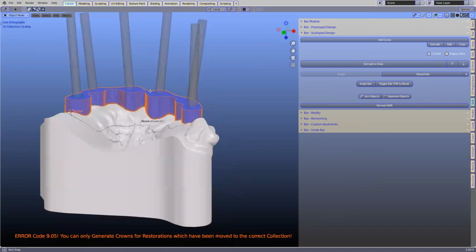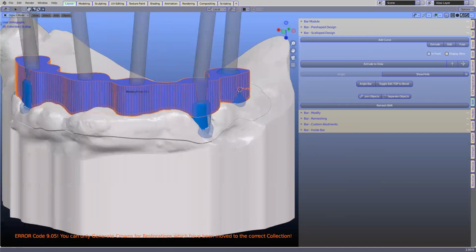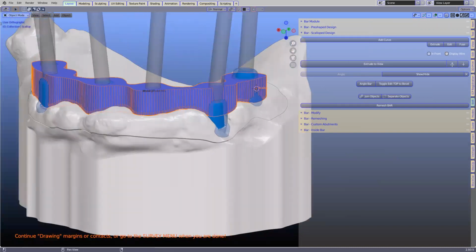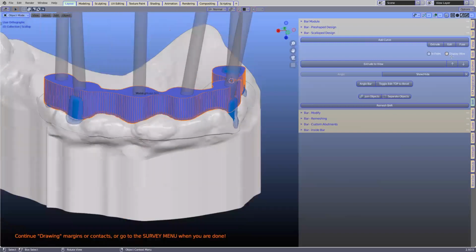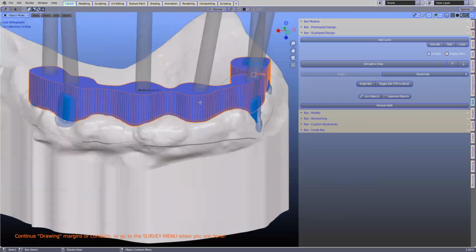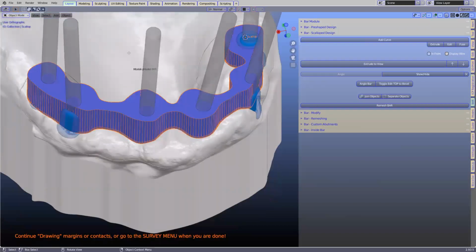And you guys may have seen designs like this beforehand. And of course we can go up or down, depending on how short or big you want this thing to be. And then also we can angle it. So if you want to see the angle, we're going to go into edit mode.